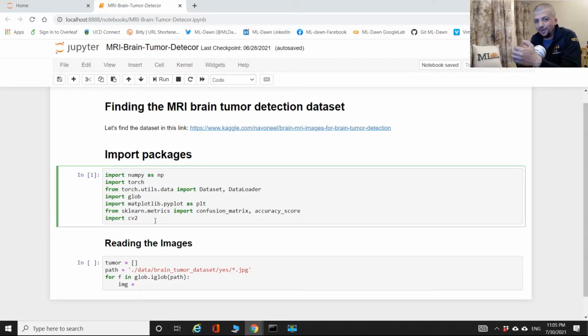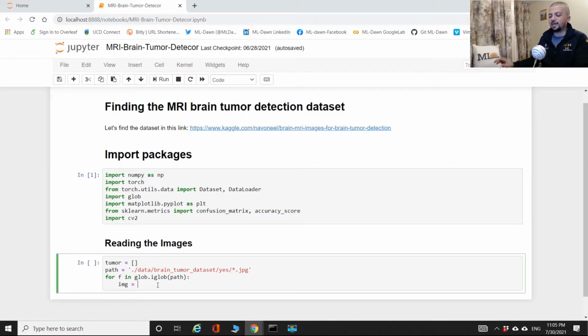So again, this is one of the ways that you can read in an image. This is just one example of doing that. You're more than welcome to try different ways. CV2 has this sub package called imread. By the way, when I put dot imread and press tab, it gives you the options. By pressing enter, I'm choosing imread, and then you put your F there.